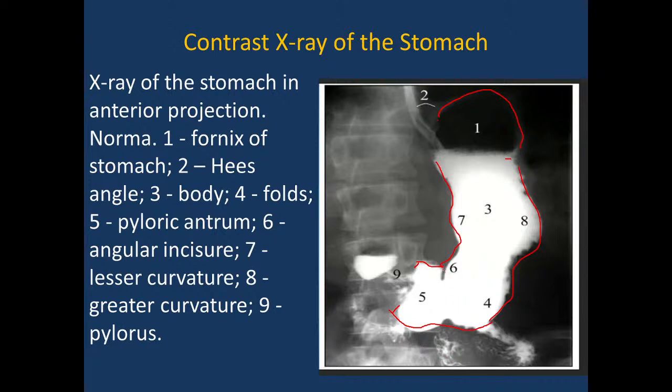And you could nicely see the folds, and you see also the two angles. The first is here, and we call it the angle between esophagus and stomach. And also we see the stomach angle, or angular incisure. This usually shows it is connected and combined with the constitution, or with the body constitution.